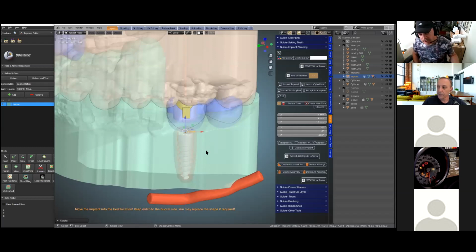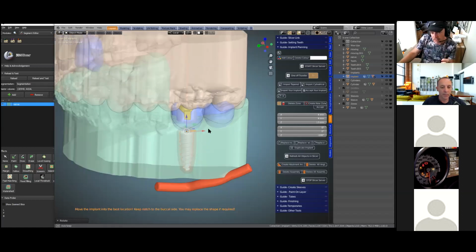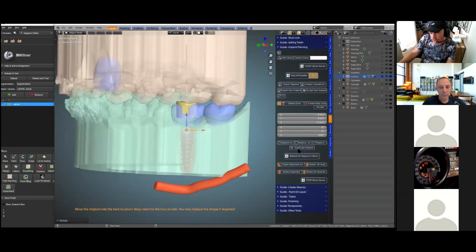Yeah, so the notch, if you've got an implant with a hexagon or whatever, you choose a certain landmark in the implant, because all of the angles that you purchase move away from a specific landmark of the implant. So this notch is that landmark. If you've got a Replace Select or something with three prongs on the inside of the implant, you choose that landmark where the actual angle moves away from it. So it's very important.